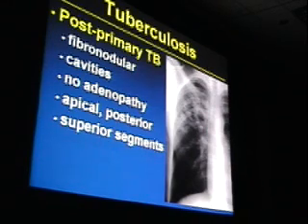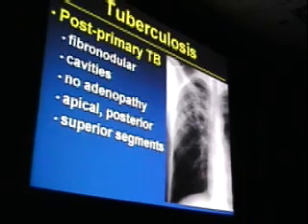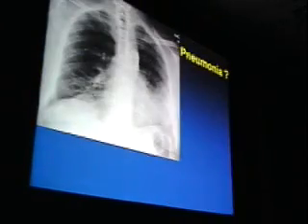Okay. And so when you see a radiograph like this with clustered, confluent opacities as well as cavitation in that upper lobe of lung, the first thing you've got to think about on this study is tuberculosis. This patient has to be isolated, have to rule out TB. It may be other things. It may be cancer with hemorrhage around it. It may be other infections. But this is TB until proven otherwise. The patient has to be isolated.